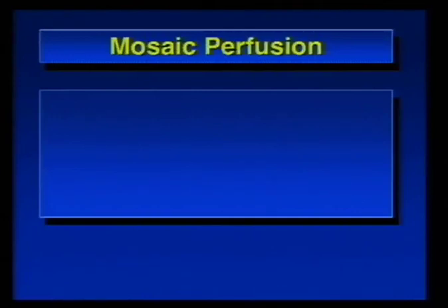That is mosaic perfusion. What is another cause of mosaic perfusion? I told you one cause is vascular, chronic PE. The other big category is small airways disease. Now, why would airways disease cause a perfusion abnormality in the lung? That seems a little bit illogical, but it's not.